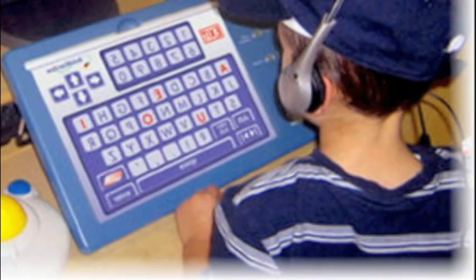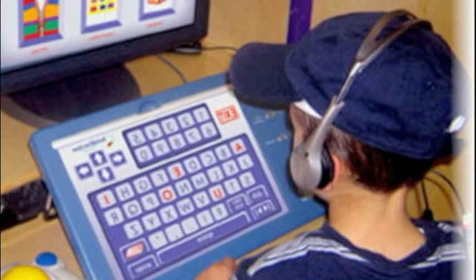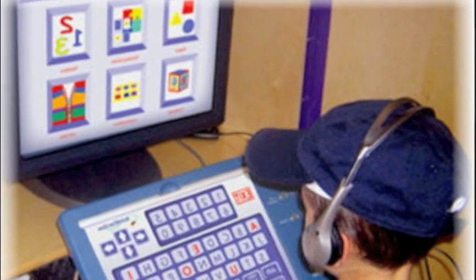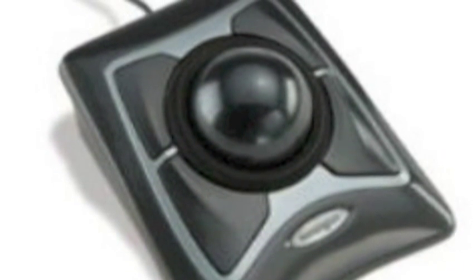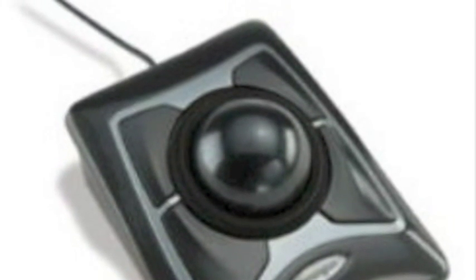Occupational therapy students striving to be licensed occupational therapists need to learn to recognize the client's abilities, difficulties they may encounter, possible solutions, and search for tools appropriate for the individual to be able to use the keyboard and mouse in order to use the computer. In this video, we will be addressing 3 types of keyboards and 3 types of mice and its impact on the wrist and forearm. The 3 types of keyboards are the mini keyboard, the standard keyboard, and the expanded keyboard. The 3 types of mice are the thumb trackball mouse, the index trackball mouse, and a standard mouse.